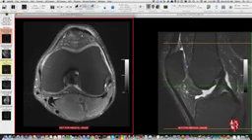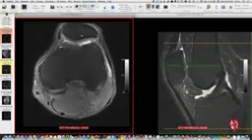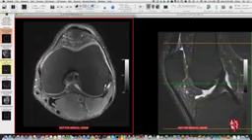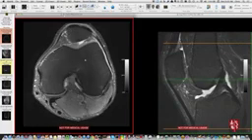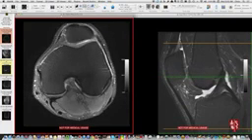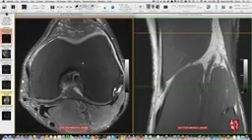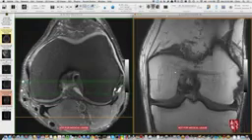Okay, so patellar bony anatomy, patellar cartilage, sweeping through, looking at the trochlear cartilage, and then looking at the patellar tendon and quadriceps tendon in axial. And then there's a number of other things one can check, okay? We'll look at some other examples here in a minute, but things like medial collateral ligament. So here we are medially. This is the MCL here, and notice that it's kind of a broad band coming from the femur. Let me switch this one back to coronal here. Find that MCL.